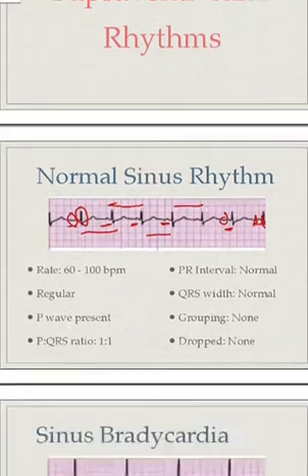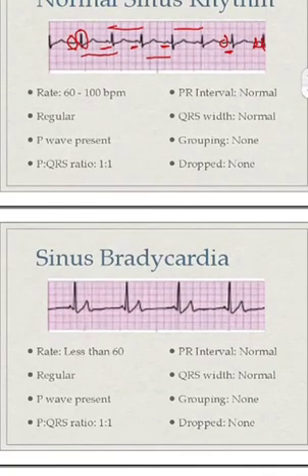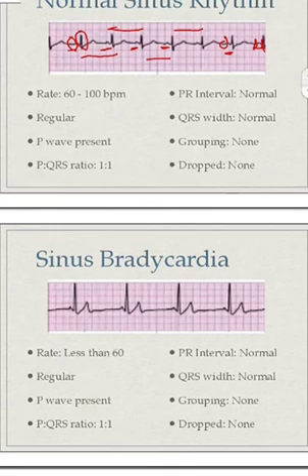Now let's go further and see how other rhythm abnormalities manifest. This is an ECG with sinus bradycardia. Let's compare it with this. In this, the rate is approximately 1 large box, 2 large boxes, 3 large boxes, and approximately 3.5, so its rate, when calculated, comes to approximately 75 to 80. While here you can see 1 large box, 2, 3, 4, 5, 6, and 7. When we divide 300 by 7, we get a very low rate, less than 60. So we call it sinus bradycardia.